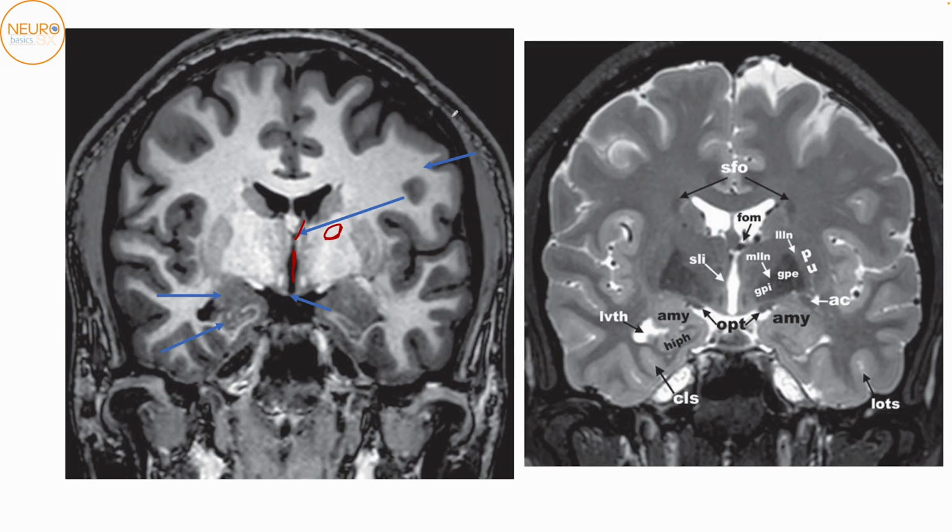Okay, so this is superior frontal gyrus, the middle frontal gyrus, and the inferior frontal gyrus. Superior temporal, middle temporal, and inferior temporal gyrus. This is your occipitotemporal fusiform gyrus, and this is your parahippocampal gyrus and your collateral sulcus. So these are all the things we possibly did not know how to identify before, but now because of the simple normal anatomy of this region, we can pick up that these different structures exist.